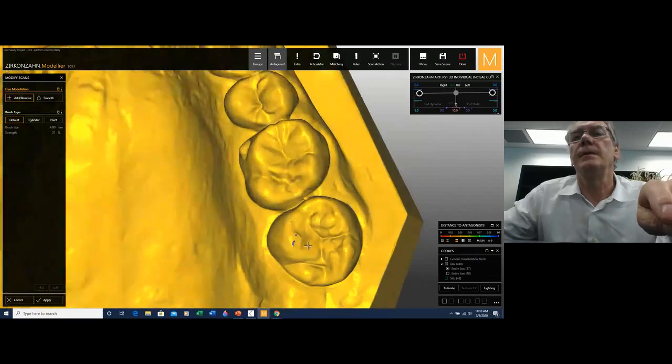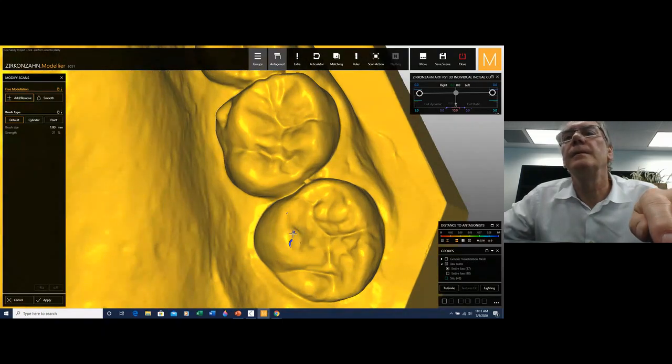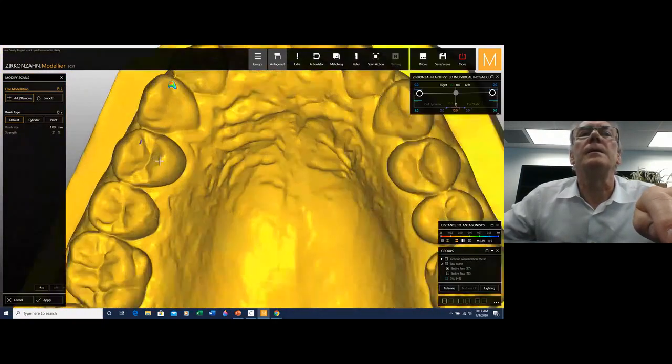Here it is. See how small it is? But you can find it. And this little contact here.